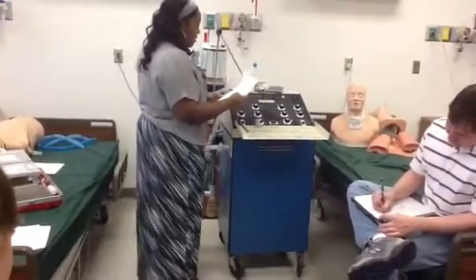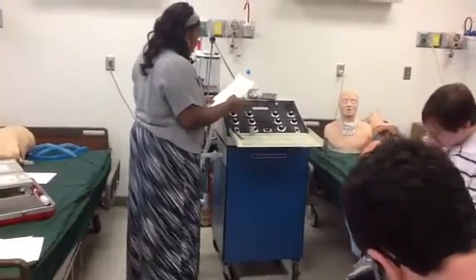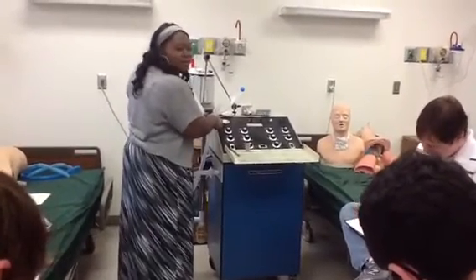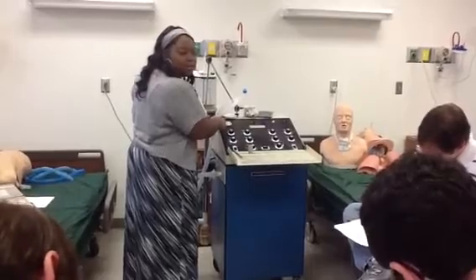We'll start from the top, which is N. Why, I don't know. But N is your pressure manometer. So that's how you would know how much pressure is being used to push the breath into the patient.